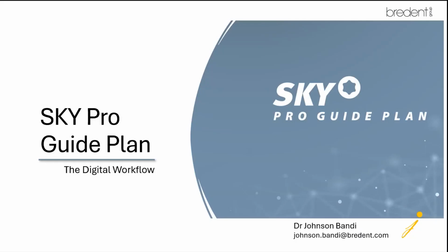I'm Dr. Johnson. Today I'll be talking about the SkyPro Guide software, module 6, and this is our last module, where I'll be talking about Sandbox. My laptop is here, so I'll be looking at the screen sometimes. I'll share my screen, just a minute. Yes, so this is our SkyPro Guide plan software.